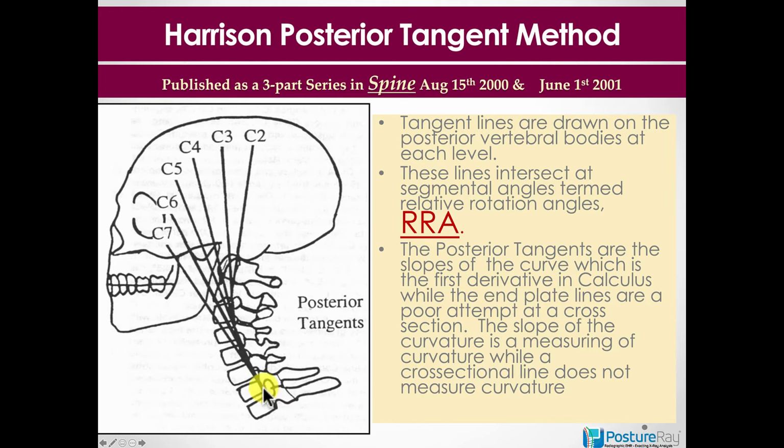Whereas on this, you'll always measure the back of the body. And if there's a posterior osteophyte, you don't measure that. You measure, if you were putting a protractor up to the spine, how would you truly measure? It truly wouldn't be on the spur.